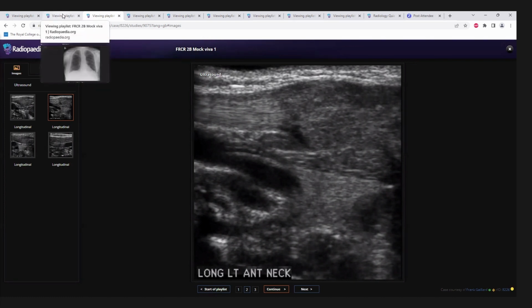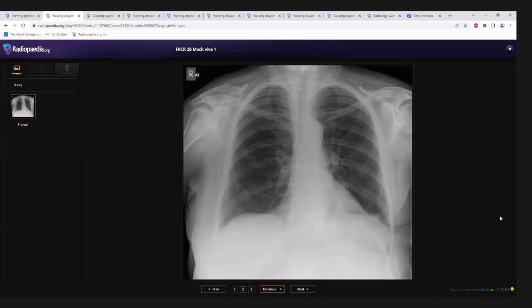Okay. All right. This is a case that we all need to keep in mind. Whenever you get a radiograph in FRCR, as Dr. Curtis always teaches us, and I'm his huge fan, please check whether there is any mastectomy or any asymmetry. First thing that you need to see is, of the breast shadows, is there any asymmetry or mastectomy? Otherwise, you will really be jumbled.